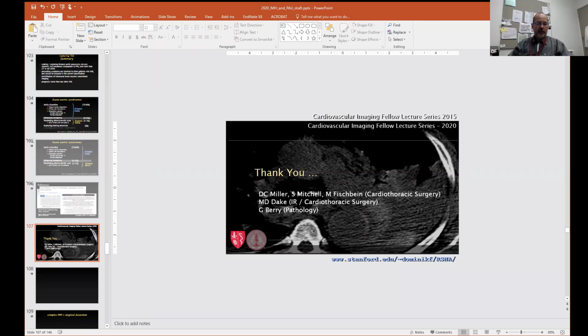So this lesion penetrates, as you said, even through the adventitia. So that's certainly an acute lesion and a complicated lesion, and that's why it was treated. So they stent grafted the patient. So she got an endograft, a zone 2 endograft. The terminology is correct.